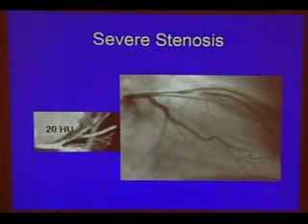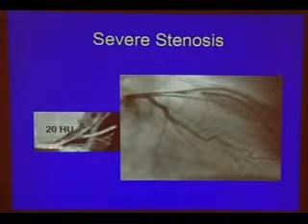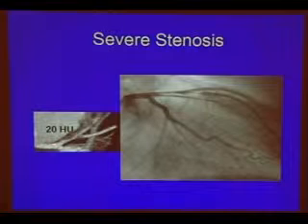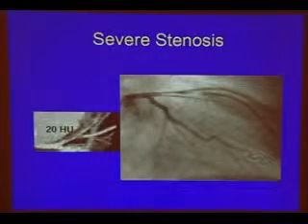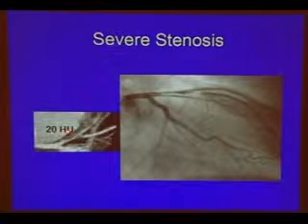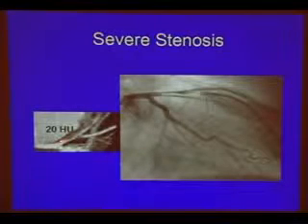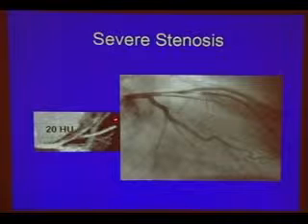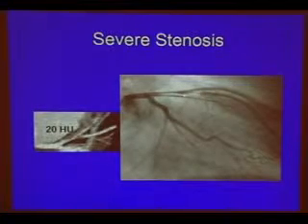Here, again, we see a picture of a CAT scan obtained with a 64-slice scanner, and we can see here that this is the normal lumen of the coronary artery, and as we go farther out, there is a severe luminal stenosis here, or narrowing, which is causing chest pain on this patient and potentially might lead to a heart attack. And there is significant plaque basically seen all along this coronary artery. Here we see the invasive imaging, which shows the significant stenosis here.